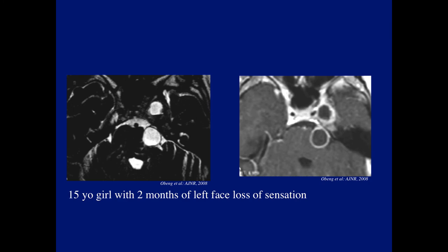Arachnoid cyst was mentioned. Anything else? It was neither a schwannoma nor an arachnoid cyst. Here's a post-contrast image involving both the cisternal portion and Meckel's cave.